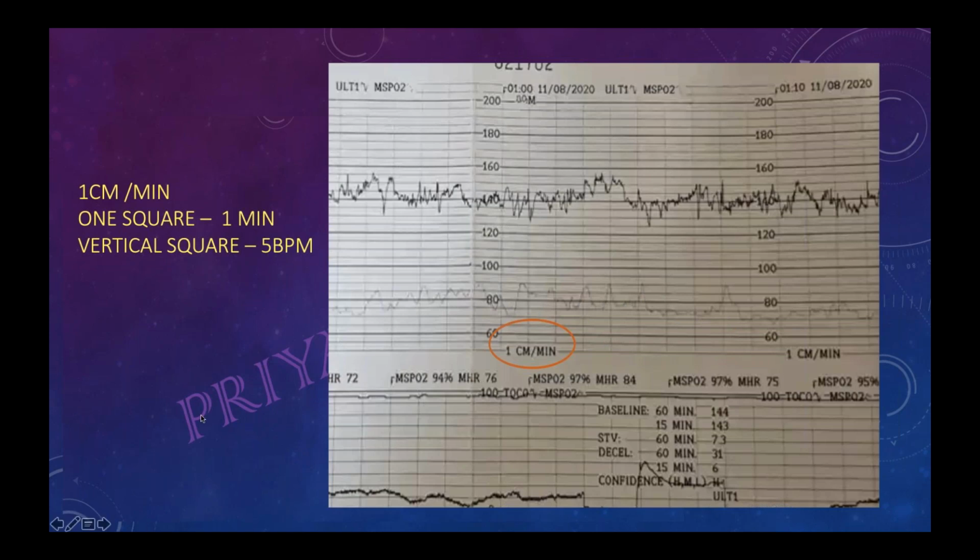So yes, there are two things. It is 80, so it should be maternal pulse. Second, they will be marking, because in the exam you will get a complete CTG. I just wanted to show you 1 centimeter per minute, therefore I put it.